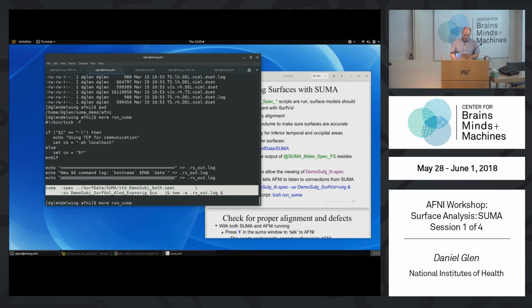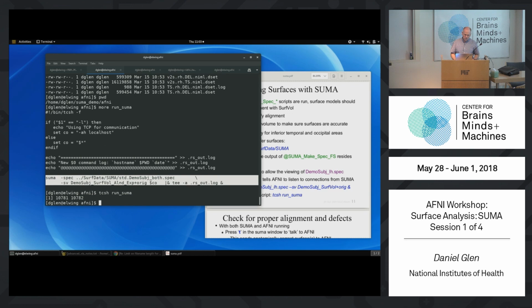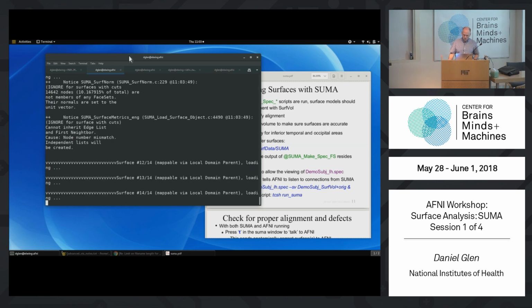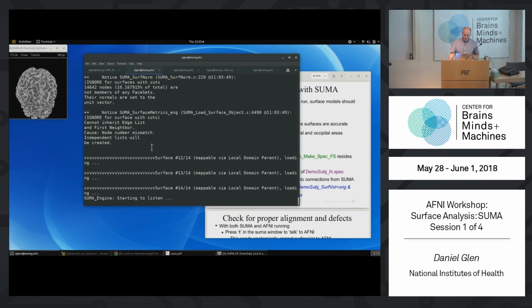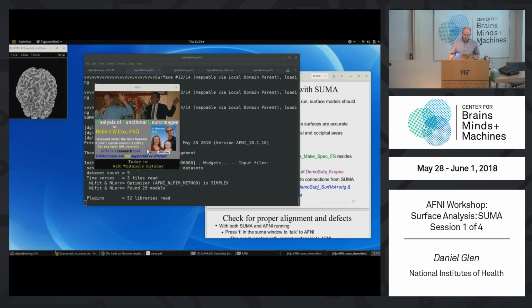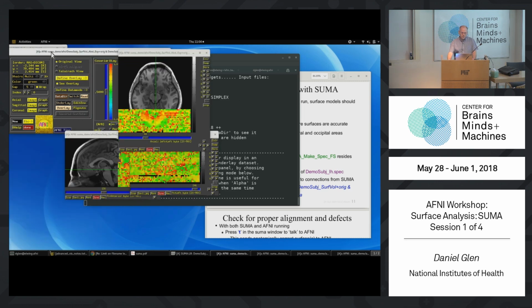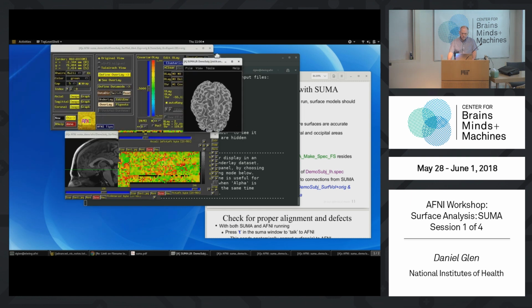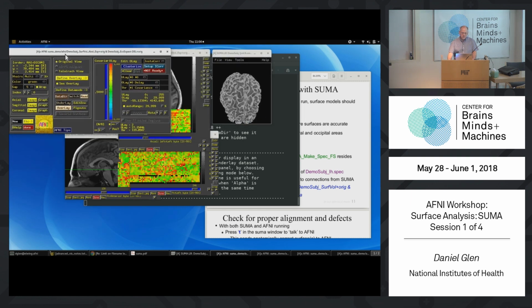All right, so I'm going to run tcsh. You should run the same. Let's see if I can type tcsh, run_suma. And did I type afni -niml? Okay, so afni -niml. And here's SUMA over here. So you've seen your first surface.